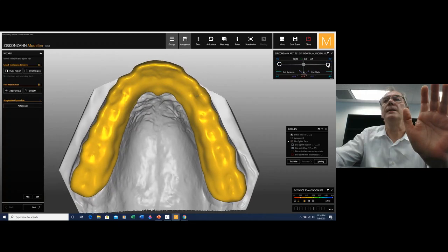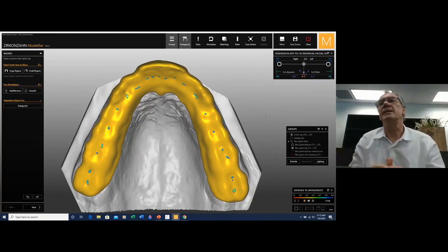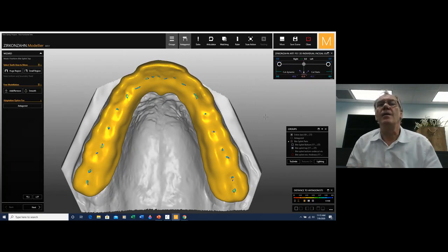The bite is very smooth and very simple, but don't be fooled by its appearance. The value of this piece of plastic is really in everything we have done to get to this point and to make sure that every single dot that you see around the surface makes sense and has a specific function. Bites, or functional bites, usually have no reason to be aesthetic, but they need to be highly functional, and they have to deliver the functionality of what our future program is going to be for this patient.